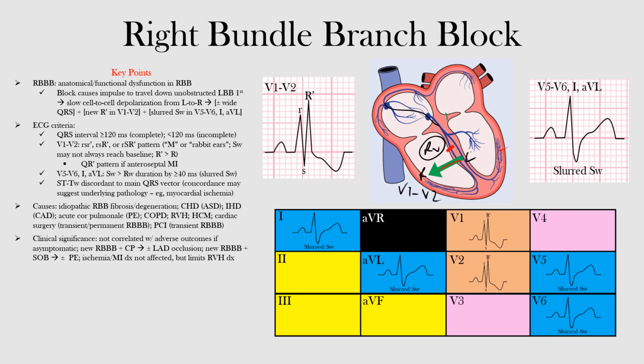Sometimes when we talk about infarctions, we'll see that Q waves can develop. If you have a Q wave, you'll have a complex that has this downward Q wave, the initial negative deflection after our P wave, and then this R prime wave. Because you have that infarction in V1 and V2, the anteroseptal region, we won't have that initial small r. That's a little bit more advanced, but when we get to infarctions, you'll start to understand this. So again, notice in V1 and V2, you have this RSR prime pattern, that rabbit ear in those leads.